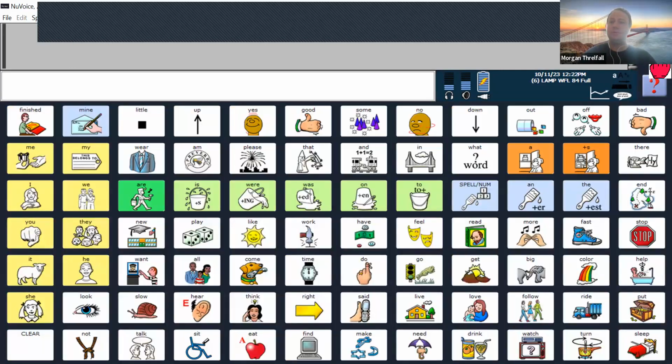So there's lots of settings buttons and things like that on the device, and a lot of students may go into the settings here. And so if students are going in the settings and it's kind of preventing them from developing their communication, we might want to put some locks on those settings. So you can lock the settings in a few ways on the Accent device.